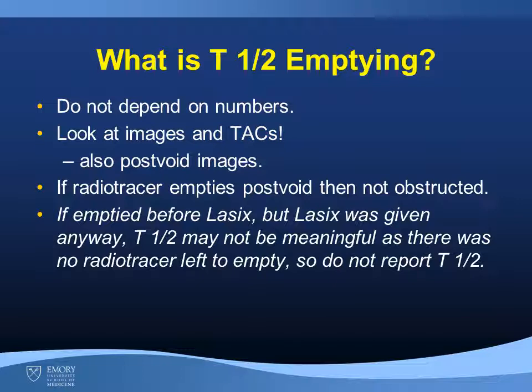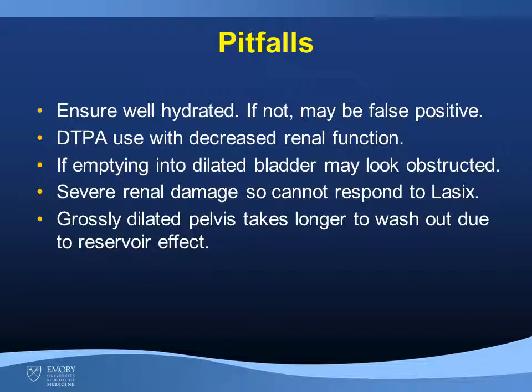Also remember, that if the collecting system emptied before Lasix, but Lasix was given anyway, the T1/2 may not be meaningful, as there was no radiotracer left to empty. So don't report T1/2 in that case, because it can be spurious. You also want to ensure the patient is well hydrated. It can cause a false positive if they're not.